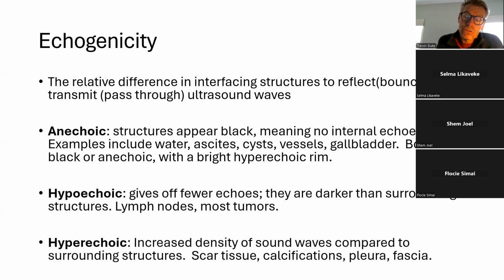Before we do that, I wanted to touch on some of the terminology that's used in ultrasound, so that we can be literate about ultrasound terminology and what it means when you read a report or when you do an ultrasound yourself. First of all, this concept of echogenicity. It's a bit like density on a CT scan: it's a measure of what produces the image on an ultrasound.